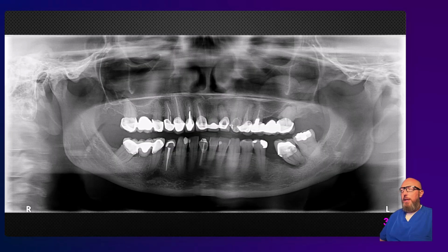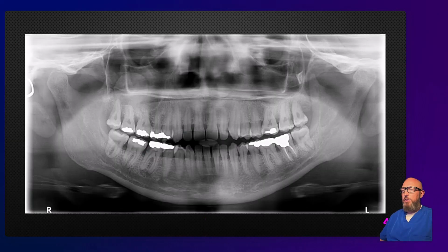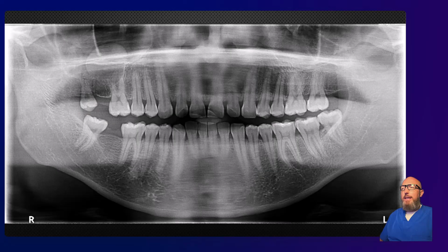Hopefully your eyes are starting to get drawn right to these. As I turn to them, you can look at the sinus floor. It's unaffected, no corticated border over the lesion. All of these are just pseudocysts. This one almost looks like it arises from the wall rather than the floor, but still non-corticated, dome-shaped, perfectly smooth, no effect on other structures. And so in summary, that's all our most common periapical lesions.